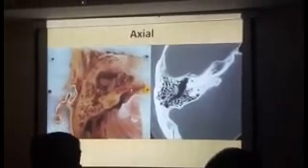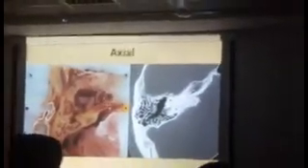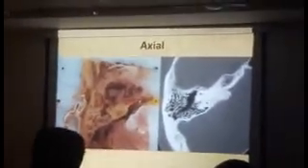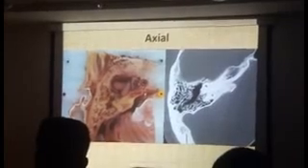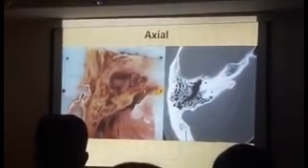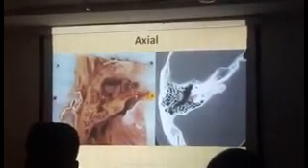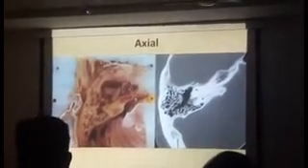Now, as far as the axial scans are concerned, my personal belief is to always read these scans superior to inferior rather than inferior to superior, because the cluttering of these structures and the sort of dirtiness that you see in the CT scan is more concentrated towards the inferior sections. Therefore, if you go from superior to inferior, you start gradually getting familiar with the structures, and hence identification of the more complicated structures in the mesotympanum becomes easy for you.